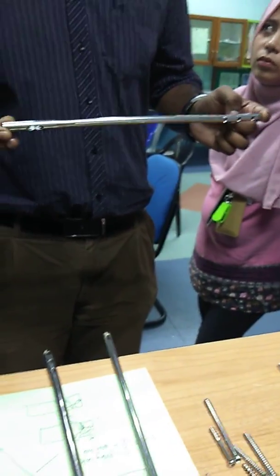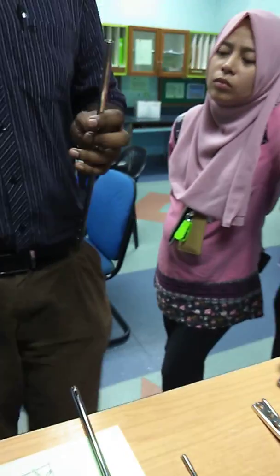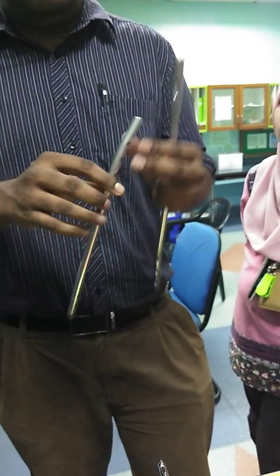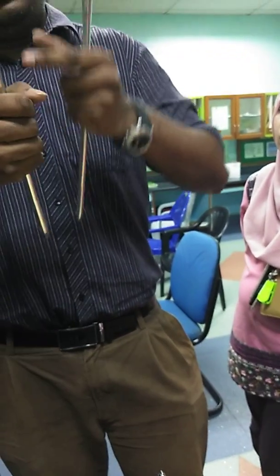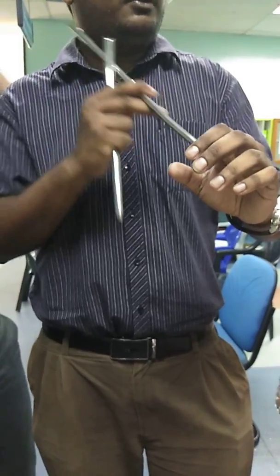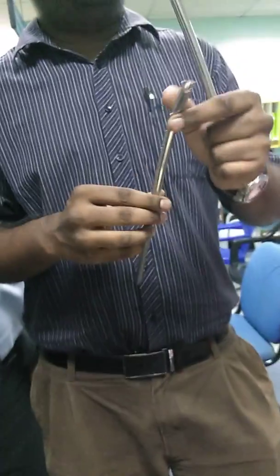So, what is the difference between ILN femur and ILN tibia? This is ILN tibia. The difference is at the proximal end, it's curved. It follows the contour of the bone when we are inserting it. We are inserting it at the tibial tuberosity from below. So once it's intramedullary, the entry point is on the anterior side. For this one, the entry point is from the superior part, your piriformis fossa or your greater trochanter. Your tibia is on the anterior part, the tibial tuberosity. So that's why there's the curve, to accommodate that.